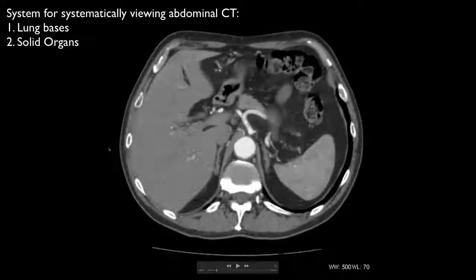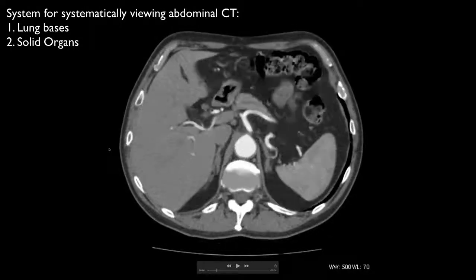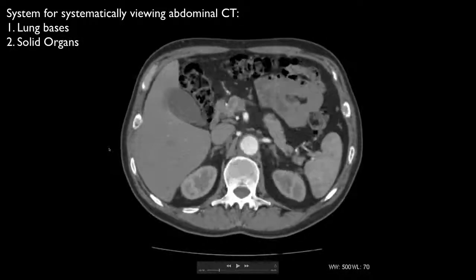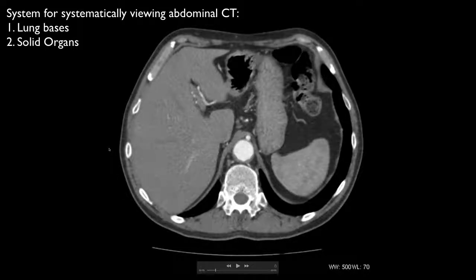Again, those presets are available. So have a good look through there. These are axial images, so cross sections, and most CTs give out these cross sectional images, but you can also get other views. You'll get coronal images, which is as if you're looking from the front, or sagittal images, which is if you're looking from the side.